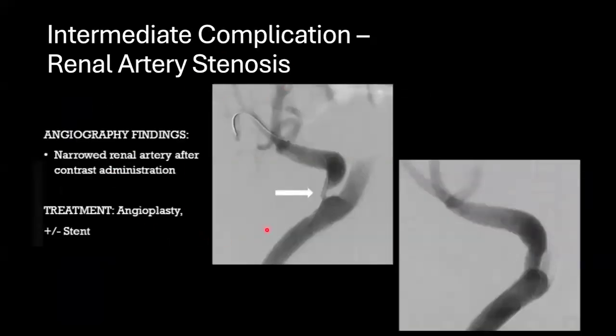And on invasive angiography, they catheterize, they can see the anastomosis and the anastomotic stricture. Sometimes if it's long-standing, you get post-stenotic dilation, but they can also do stenting or angioplasty and just fix the problem. And we have, unfortunately, cases where this has been done, specifically angioplasty, and then you get recurrence. So these patients would require close follow-up.